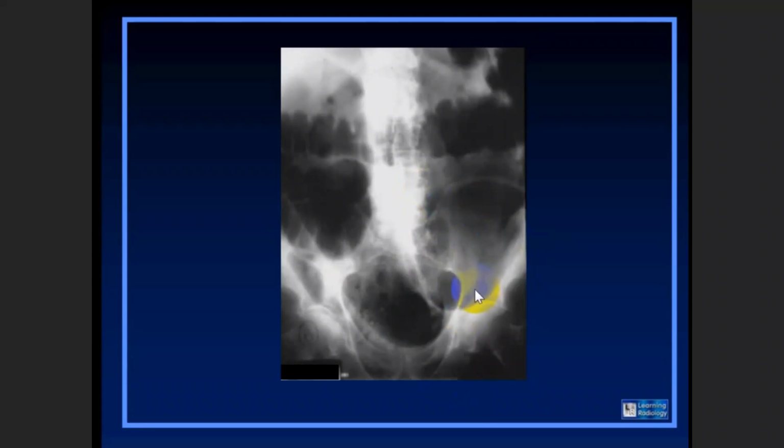And in the sigmoid colon, an elderly male patient commonly has volvulus. So it gives this dilated loop originating from the left lower quadrant. So this is the axis of rotation of sigmoid volvulus.